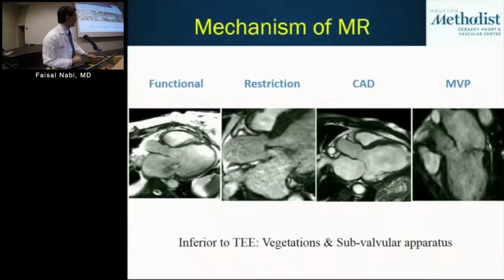So, when it comes to the mechanism of mitral regurgitation, these are just a few example slides of different cases of mitral regurgitation seen by CMR.